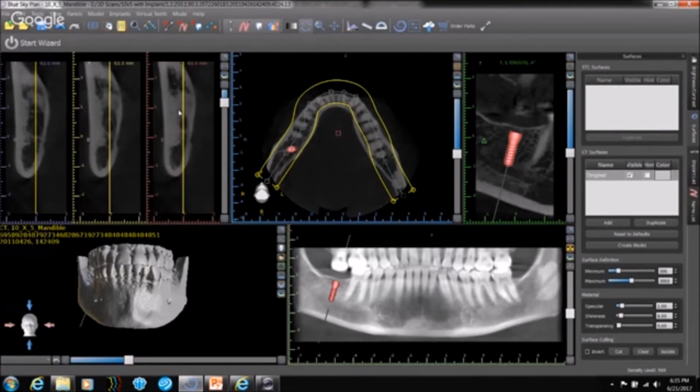So even within that, does that mean that is an unhealthy place? It's not. It just happens. These are called dense bony islands. These are anatomical variations, typically, unless there's a systemic condition or drug-related or any kind of drugs that are used to treat any underlying systemic diseases. These are also visible. Does this mean that they are not good implant sites? No. In fact, they are probably a better implant site in case you see dense bony islands.